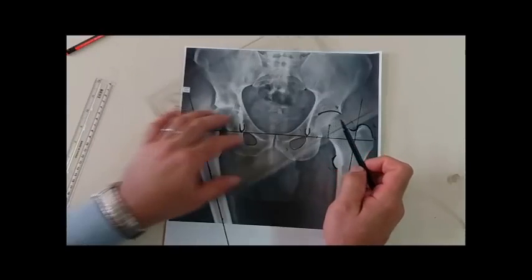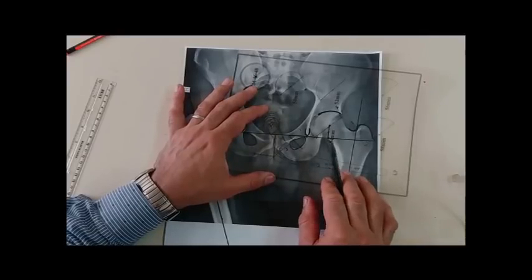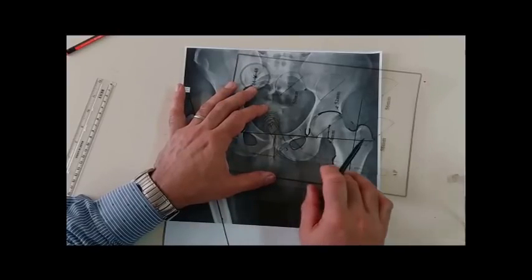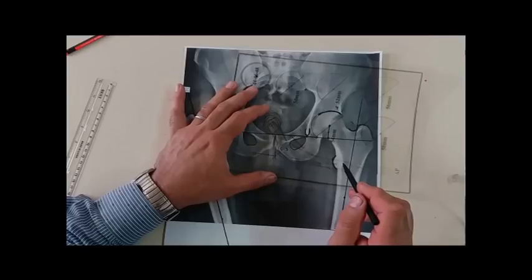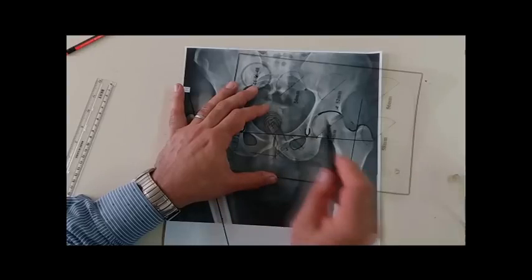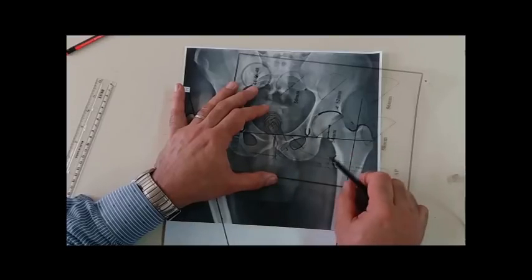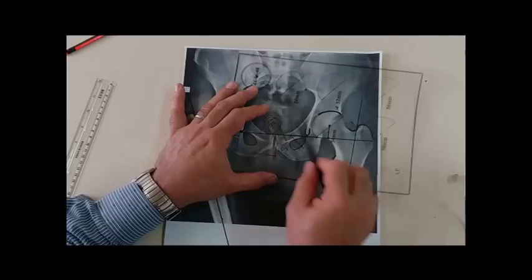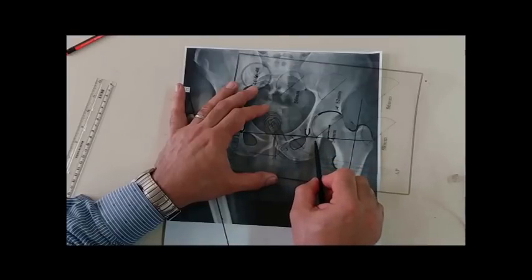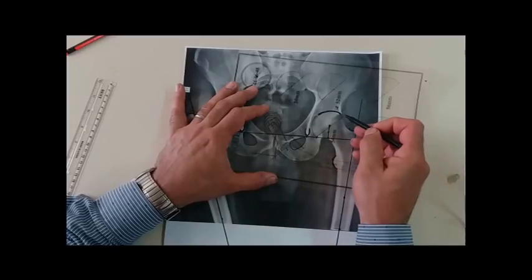In this case we can imagine some center of rotation by putting the templates of the acetabulum just as I mentioned previously. The inferior lip of the acetabulum shouldn't pass inferior to the interteardrop line and shouldn't pass medial to the lateral lip of the teardrop. For example, I put this template with these criteria: do not go below the interteardrop line, do not go medial to the lateral lip, and slide and cover.